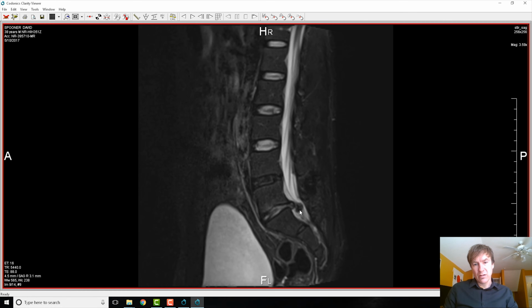So again, here's probably the main sidewall of the disc. It's fibery, and then this is a jelly material that has blown out.